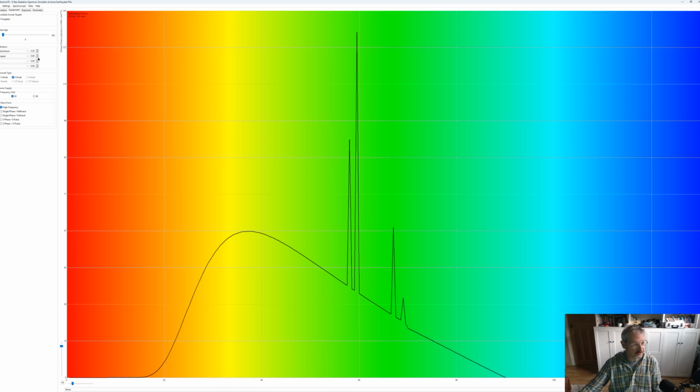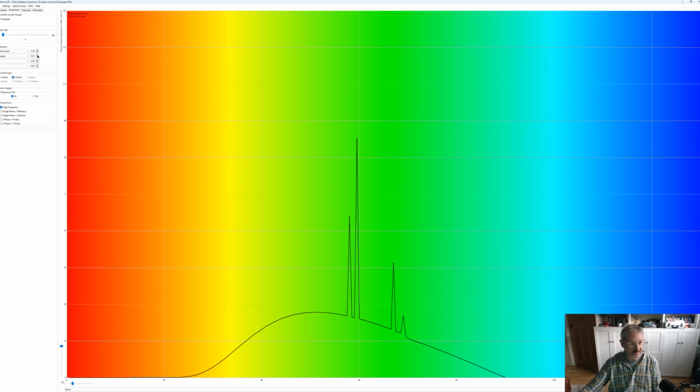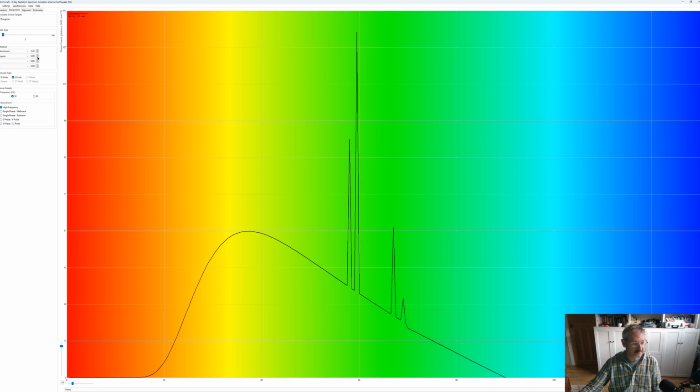And if we add copper filters, as you said, what will happen if we add copper filters? Do they remove the spikes? I did expose that, didn't I? So why isn't there a beam? Oh, I have to choose it as the default one. Yeah, okay, so now if I add the copper, you can see what's happening.